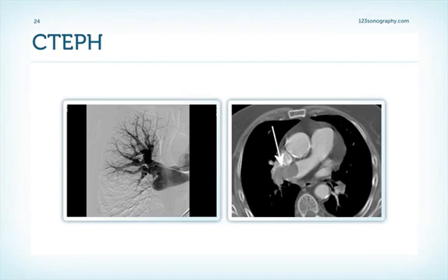The diagnosis is usually confirmed by CT scanning, so have a look at the CT scan on the right side. The arrow indicates contrast sparing, reflecting a huge thrombus that got stuck in the pulmonary artery of this patient. On the left side you can see a pulmonary angiogram that's nowadays only rarely performed to make the diagnosis, but it's pretty impressive as in this case because it shows a huge perfusion dropout of almost half of the lung. Well, you've probably noticed that the pictures are not from the same patient, but should give you an idea of different methods diagnosing pulmonary embolism.